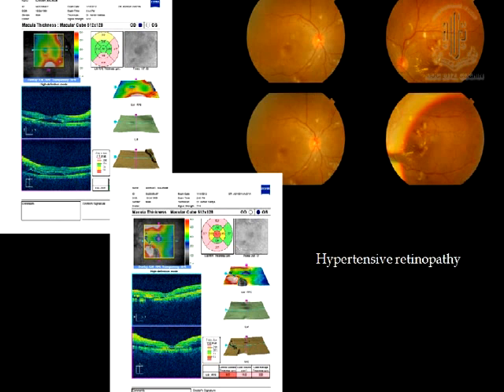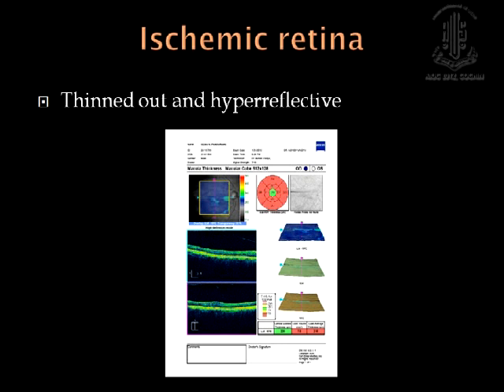This was a patient who was scheduled again for fundus fluorescein angiography. We saw the patient on clinical examination, and I thought the patient had high blood pressure. Asked the anesthetist to take the blood pressure, and the blood pressure was 220/160. And you can see that there is a diffuse subretinal fluid over here, which is very characteristic of severe malignant hypertension and hypertensive retinopathy.